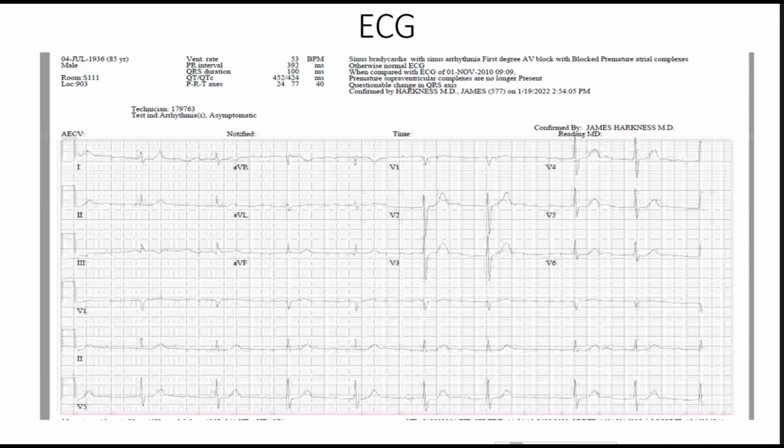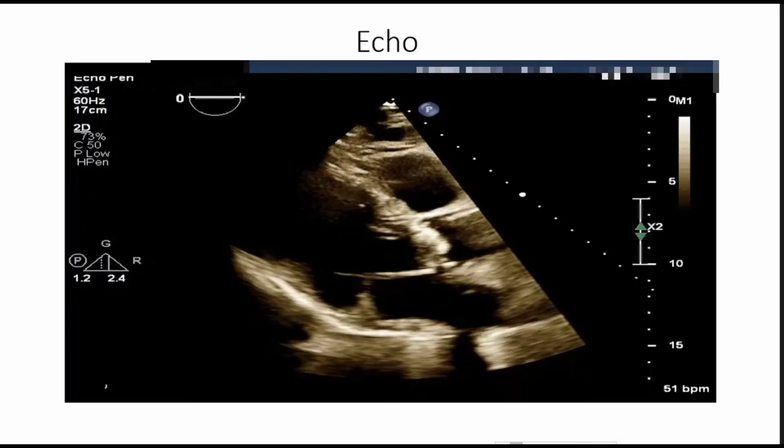His EKG is here, and it shows a fairly prolonged first degree AV block and some, again, non-specific changes that we're seeing, but otherwise it's a normal looking EKG.